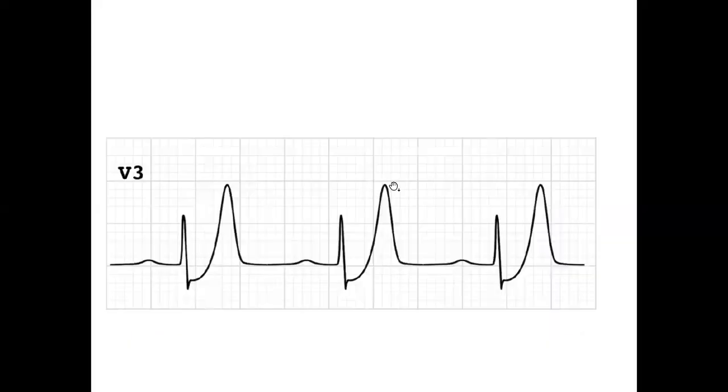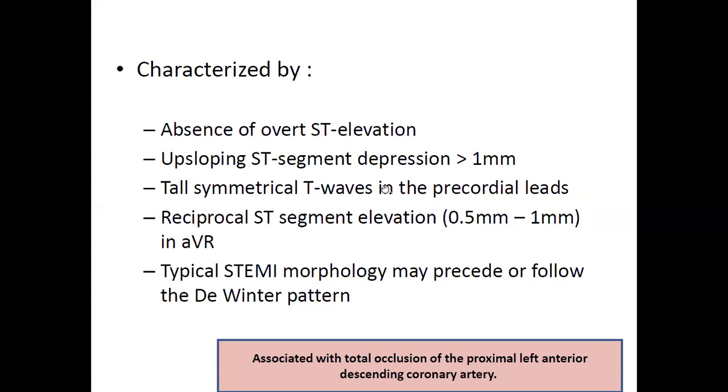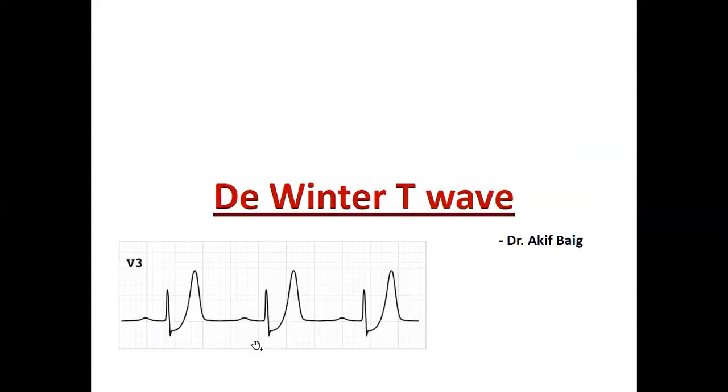So this is very important, and it is often missed by many clinicians. So you should be aware of this de Winter T wave.